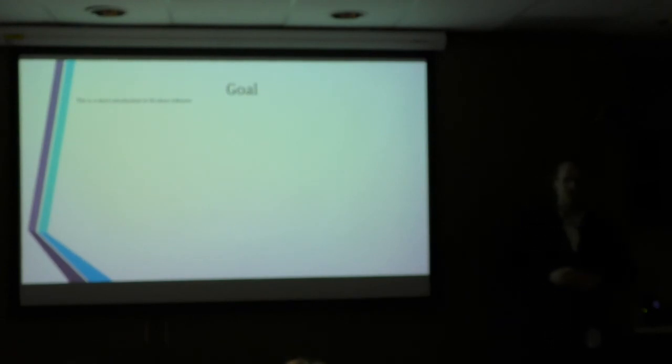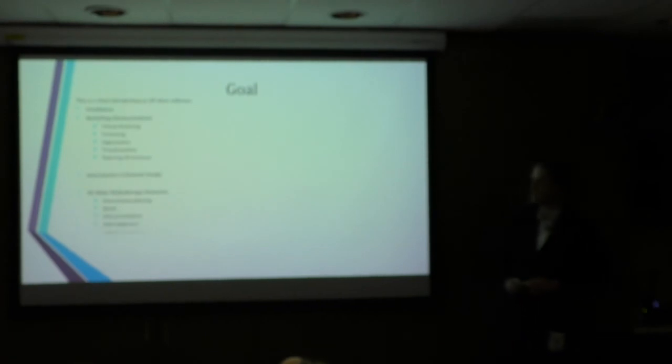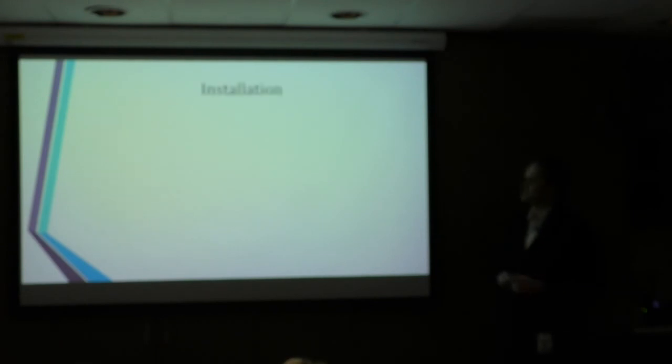So today's goal, we hope that we can go through various different components, including how to install Slicer, just very simple modeling of Slicer as well, and various different components of what we can do in there. And as I said, we'll have that intermission period, followed by Samuel's part, where we'll go into various few other applications of Slicer. So first of all is the installation.